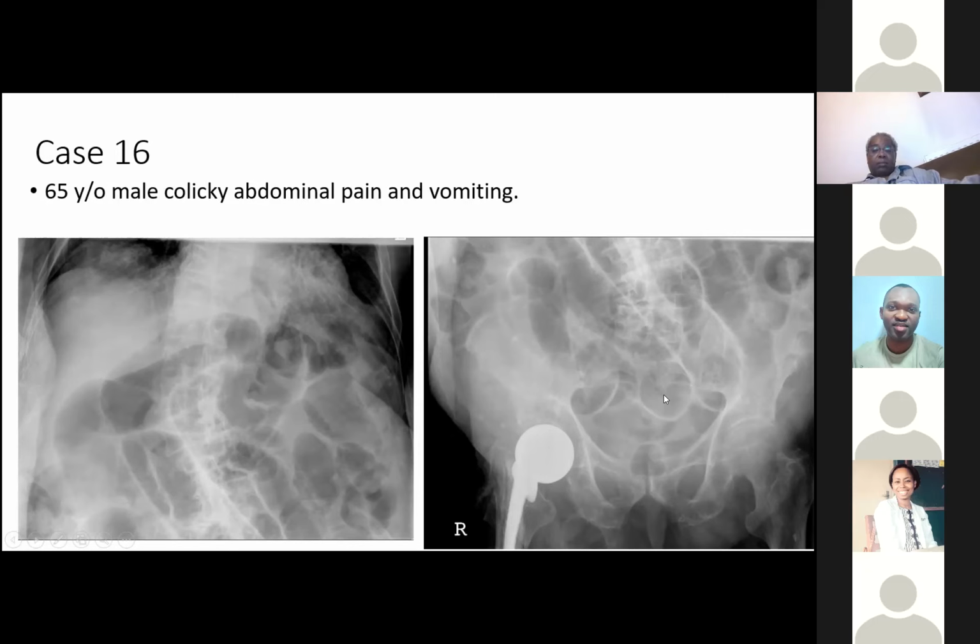Now, in this case, you can actually see the cause of this. The patient's got small bowel distension, or distended loops of bowel, and you can see on here, for example, you've got your stack of coin appearance. So this is small bowel. If you look in the flanks, you can see some large bowel, but it's not distended. So on the basis of that, we're thinking it's probably going to be small bowel obstruction.